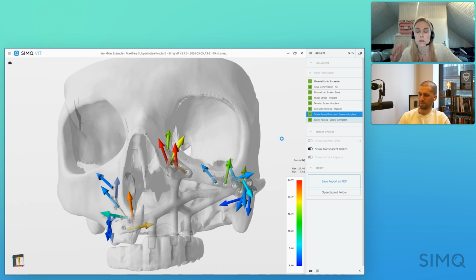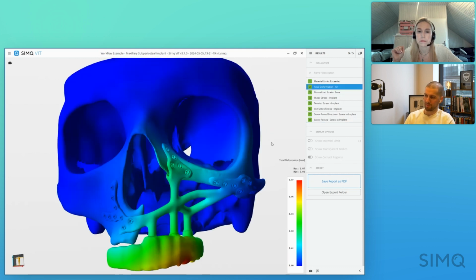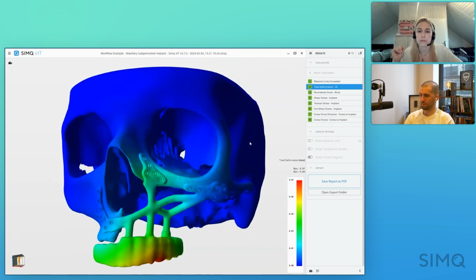Mm-hmm. I like that also, this, Kelsey, the most complex flow. Yeah, also in terms of communication, right, the engineer can actually look at the quantitative results from an engineering point of view, or the designer, but then the physician or the doctor just looks at red bad, green good, which is a much simpler way.